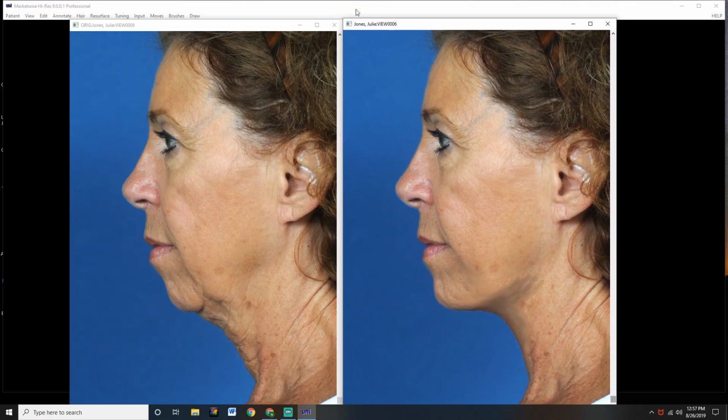Once you get good at doing this, let's go back to sizes and go back to the tissue brush. Once you get really good at doing this, you can really make the presentation pleasing to the point that when the patient sits down, you get the oohs and ahs of, oh my gosh, that's exactly what I wanted to look like. And we absolutely get that from patients.